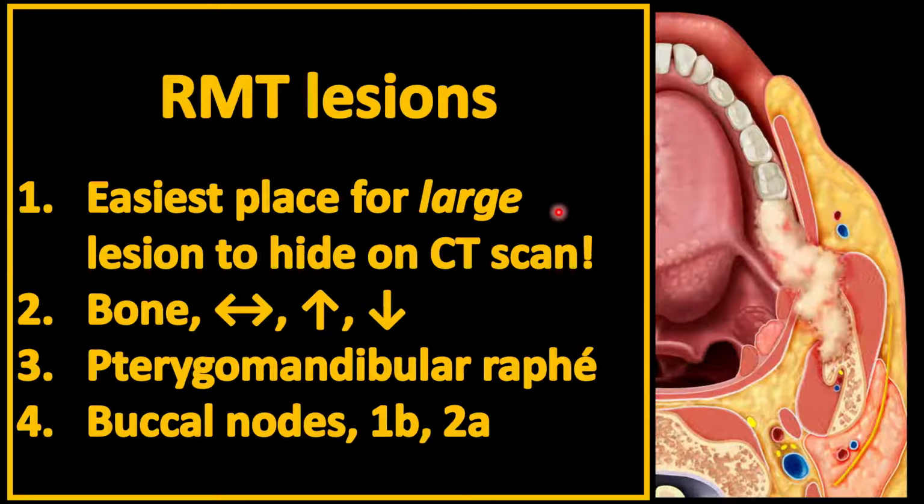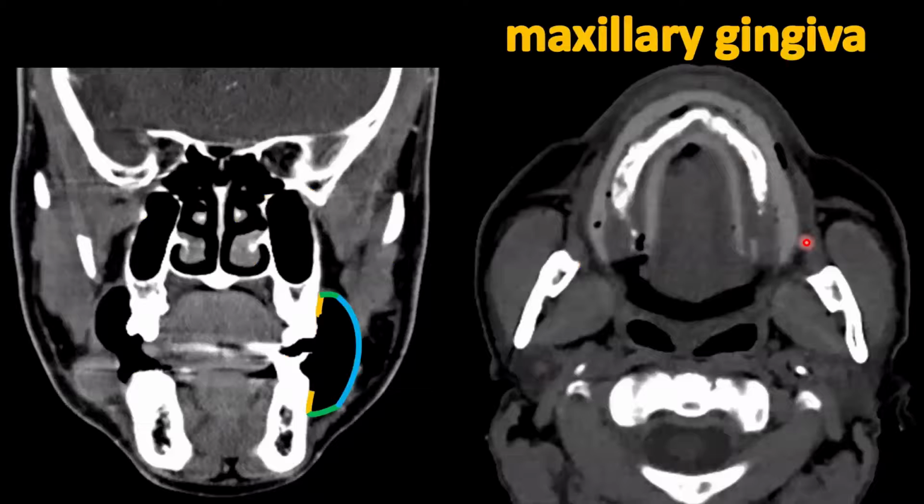So it can be amazing how big these tumors can be on scans, and we miss them. And frankly, it's a little embarrassing at times when we see reports, because once you know it's there, it's always really, really obvious. But they start here, come back, and then travel upwards, keep going back towards the mandible, or go anteriorly here at the body of the mandible, go anteriorly here along the buccinator muscle.